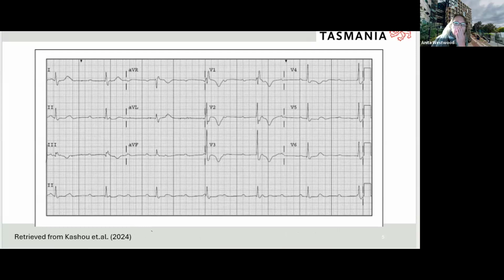So you're looking at it, and you can see there that the inverted T wave has altered that, and that's what you'll get with that reverse repolarization. That will affect the QRS width. So overall it's your V1 and V6 that we're looking at there. But you can also look at V2, for instance, and V5, because they're septal versus lateral leads as well. But overall, the QRS complex is not wide enough, so it's incomplete.